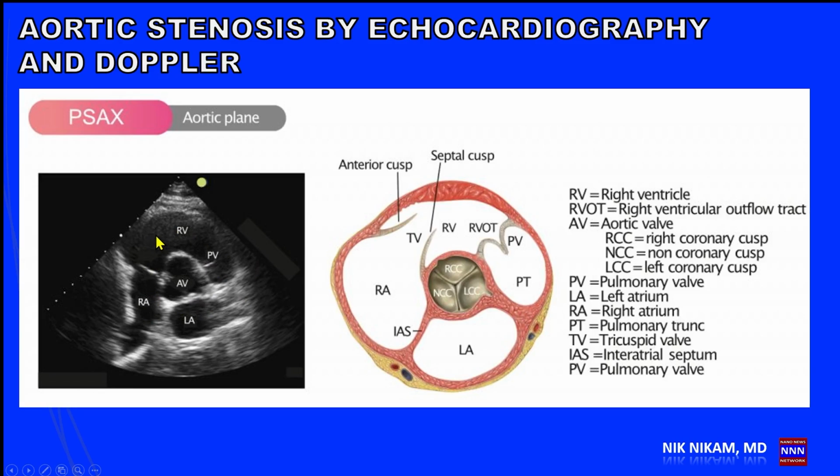and when you're looking at these things, you also want to look for any evidence of the presence of a pacemaker, which may suggest to you that there may be some other conditions associated with this patient which may also account for the patient's symptoms. And if the patient has a pacemaker, if it's just a single chamber pacemaker, there could be septal abnormalities related to the ventricular pacing.